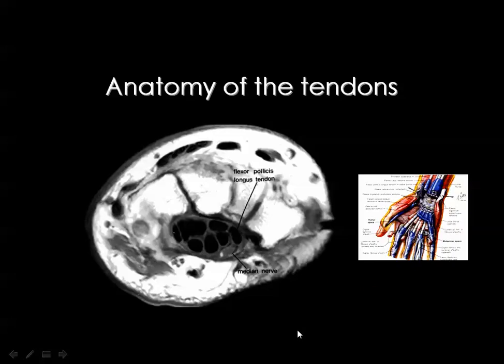Then we came to the tendons, and you know that the tendons around the wrist are numerous. Then I would like you to concentrate with me so that you are able to remember all of these tendons around the wrist, those on the volar aspect and those on the dorsum of the wrist. You know that this is the trapezium, and this is the trapezoid, this is the capitate, and this is the hamate. The hamate has a famous hook. The trapezium has a small tubercle.